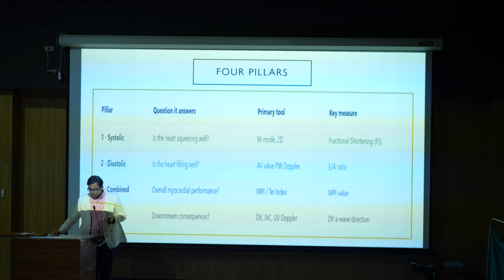And then the venous assessment, which will tell us about the downstream consequences of the abnormalities, based on either ductus venosus, IVC, or umbilical vein Dopplers. These are the vessels where we can assess the venous function, and the key measure is the ductus venosus a-wave.